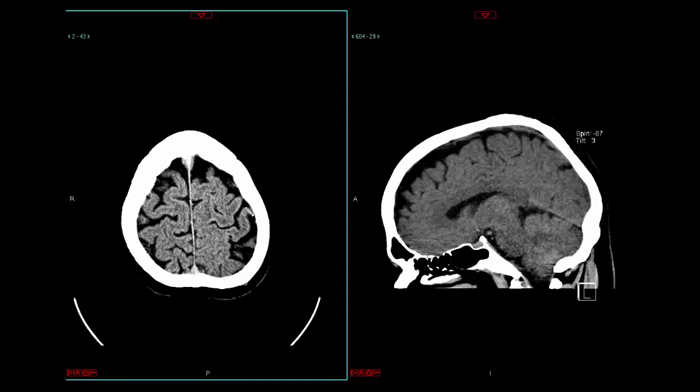The first structure I want you to appreciate at the top is this sulcus right here, and this is going to be an important landmark for a number of reasons. This is on the left side of the patient, and this is on the right side of the patient. This is the central sulcus, and the way you can appreciate it is by the inverse omega sign that you see right here on this side, and a little bit more gradual on this side. Anterior to the central sulcus is the frontal lobe. Posterior to the central sulcus is the parietal lobe.